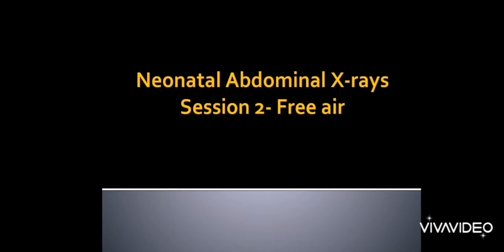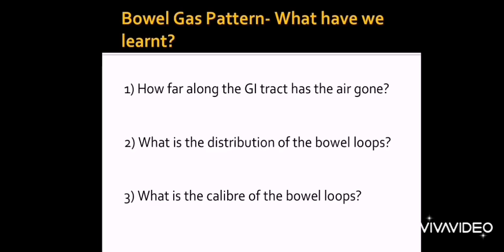Hi. We are today just going to talk about neonatal abdominal X-rays, and this is session number 2. So we're looking at free air. If you haven't looked at our first abdominal X-ray session, then go back to that. That should be one of the earlier videos. And we're just going to have a little overview of what we learned in that session.